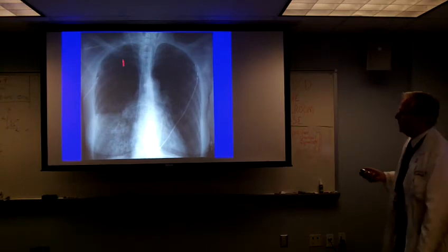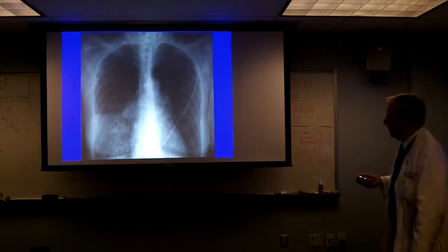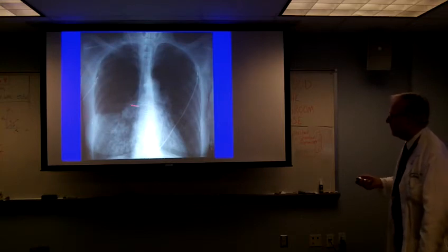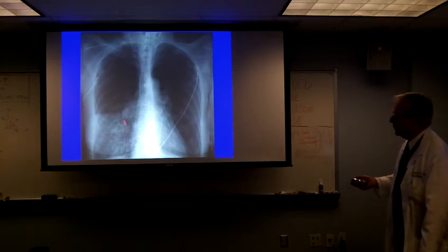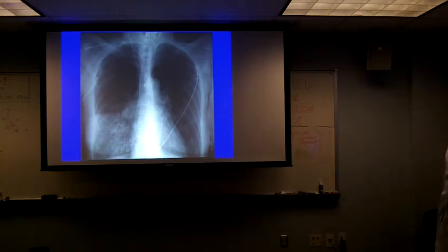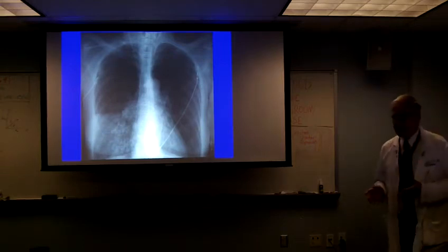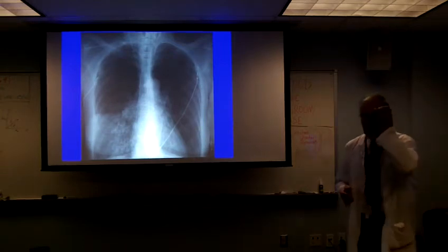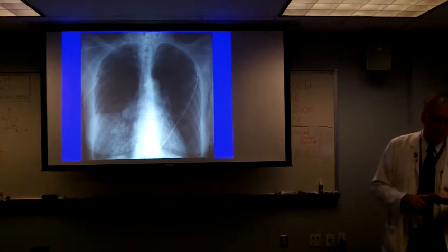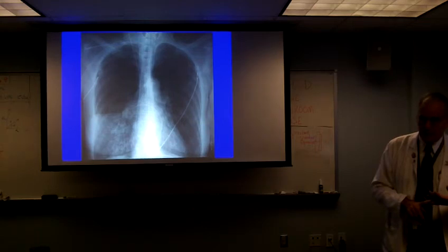Okay, here is a patient who's got a Swan-Ganz catheter in. You see where that tip is? Way too far out. But the question now is, what is all this opacity down here? This is something you probably have not heard about before, but the two most dreaded complications of malposition of a Swan-Ganz catheter are pulmonary artery rupture and a pulmonary infarct from occluding the pulmonary artery.